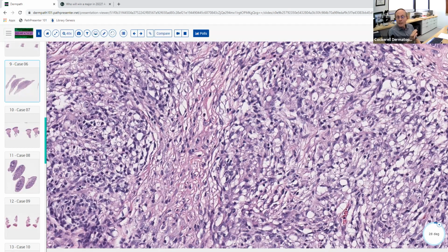Good. Now, can you get this diffuse involvement inside the histiocytes in leishmaniasis also? Yeah, I would think so. You can. And which form usually gives you that? You don't have to tell me the actual name of the organism, but usually the Old World form will tend to give you more diffuse involvement of the histiocytes as opposed to the marquee sign. The marquee sign is more commonly seen in the New World form of leishmania.